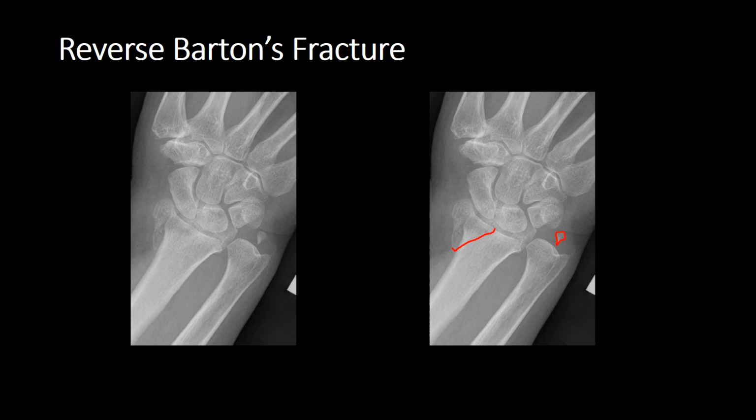On this patient, we can see that there is the intra-articular component, again involving the scapholunate fossa. So this is quite a common location when there is an intra-articular component. Although you should always pay close attention to all aspects of the radial articular surface, you should be aware that the scapholunate fossa is most commonly affected, so that's something to look out for.